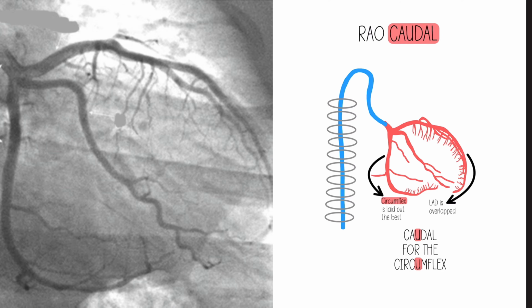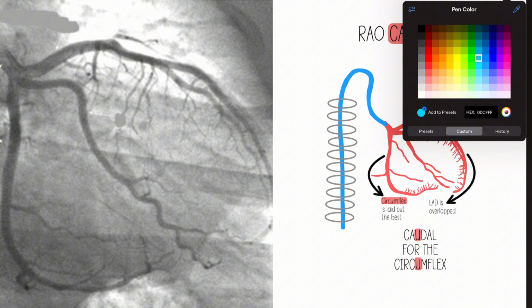Welcome to the next part of this coronary angiogram and view series on YouTube. What we are going to talk about is walking through each of the views individually and give a couple examples. So first up, what this video is going to be all about is RAO Caudal.